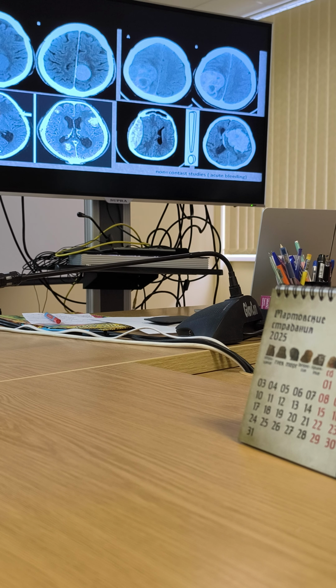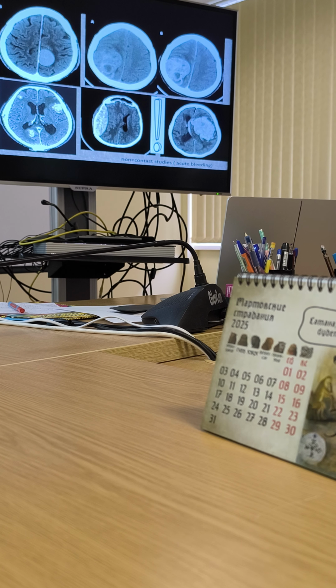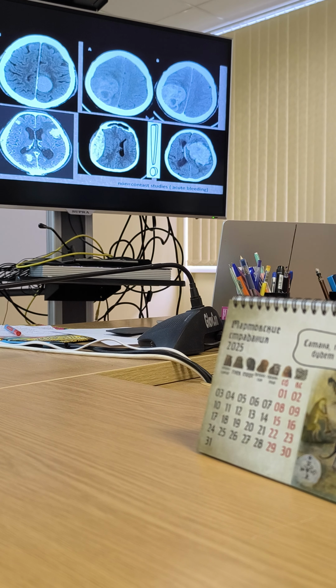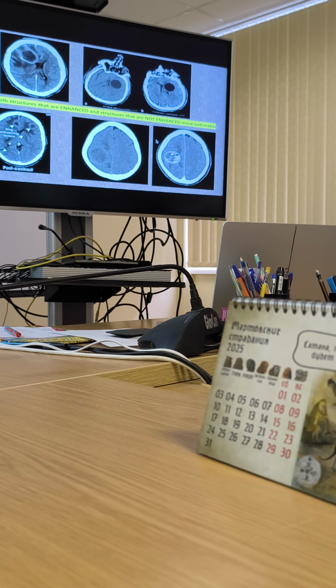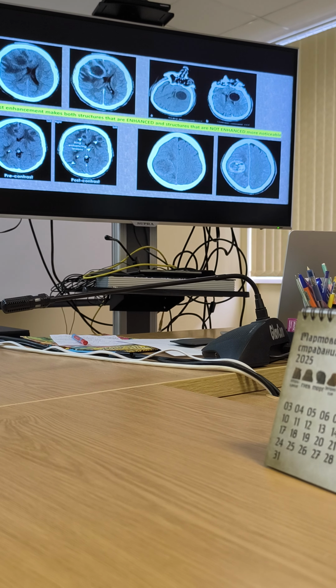What are your guesses? Enhancing. Malignant tumor. Malignant, yes, tumor. They have different histology. In this situation, these tumors are meningiomas. Benign meningioma, malignant meningioma, and this tumor is glioblastoma, another type of tumor. Okay, so from these, other tissues are also enhanced. They are both enhancing because they are tissues with vessels, with different amounts and quality of vessels.